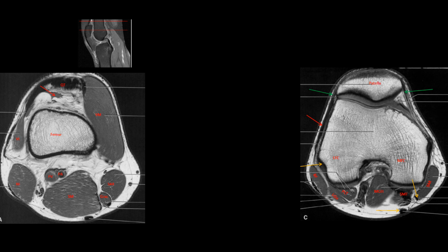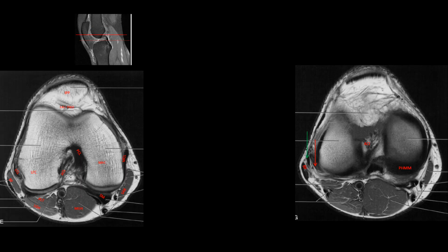And then if you look at the second cut here down below, you can actually see the patella and how it sits in there, and start thinking about your muscles here that you would see here. So be able to look at this anatomy a little more in detail in your anatomy books. And here's cuts a little further down, closer to the end here, where you can see your PCL, your ACL, your calf muscles here are all abbreviated there. So you can see the inferior portion of the patella.